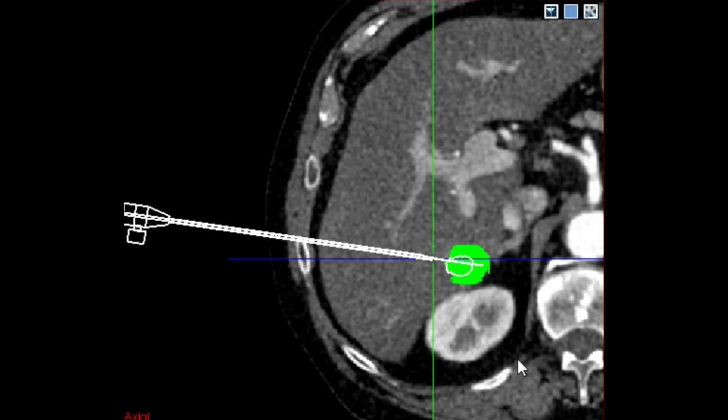We propose a three-stage visualization system for evaluation of real and simulated minimally invasive cancer treatment. In contrast to organ resection, minimally invasive cancer treatment locally destroys cancerous tissue. Interventional radiologists insert energy-emitting probes into the tumor. It is crucial to destroy the tumor as well as a safety margin of healthy tissue around it.